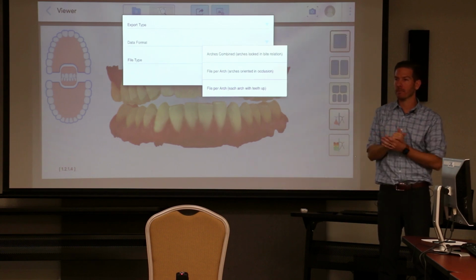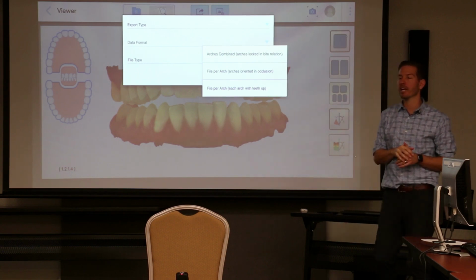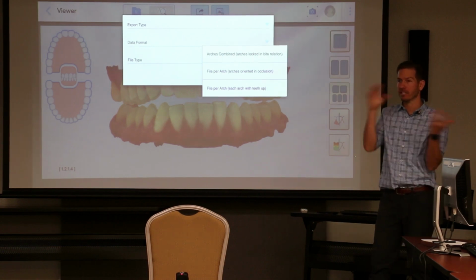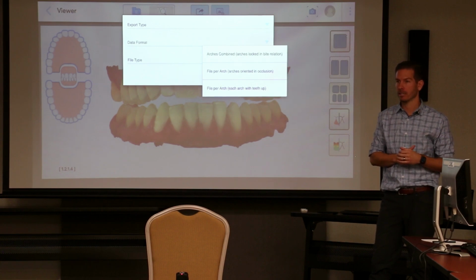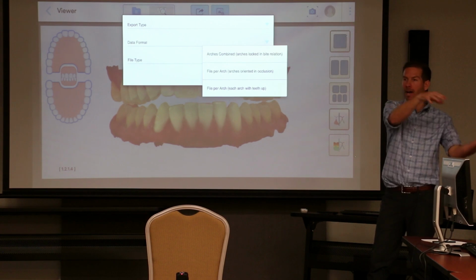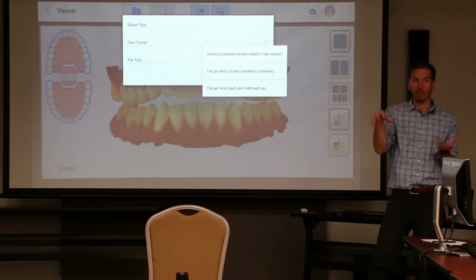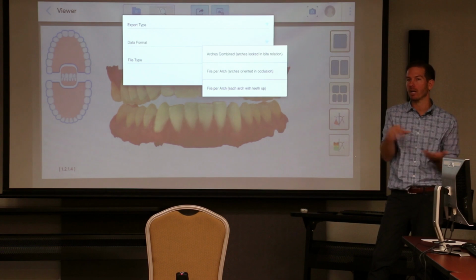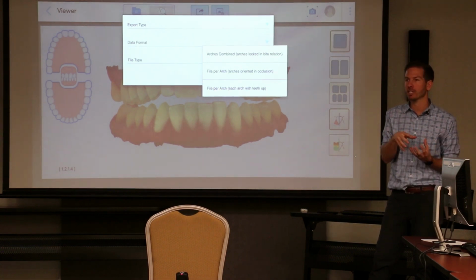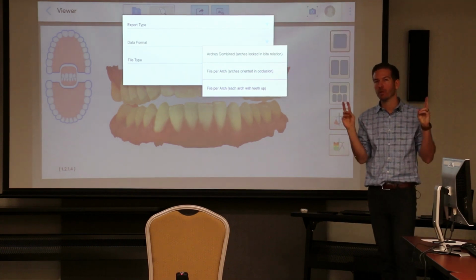They know? Blue Sky knows, yeah, because it has a location in space, in 3-dimensional space. ExoCAD too, so Frank can take those and he'll have them. Yeah. If you send them to any software, they should just both lock in together unless they got moved. If they got moved, you exported them out, they're going to be where they were moved from. And so that's an important concept once you start learning with file types and manipulating software: the relationship to one another. They have location memory.